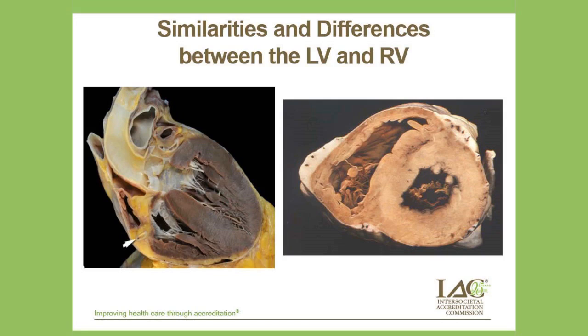The right ventricle does not have the capacity. Now, about 80% of normal RV function is actually movement of the RV from the base towards the apex. That is the reason why we check the TAPSE or the S prime in most of these cases.